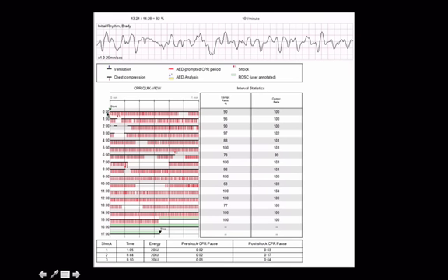In this lower section, each line is 1 minute during the time of the resuscitation. Each little red hash mark that you see is a compression. Therefore, sections like this are sections of compressions, and a section without little red hash marks is a pause. At the end of each minute, you'll see a compression ratio. So this is the percentage of time during that minute that you are doing compressions, and for that minute, what your average rate was. You'll see that minute by minute, that varies depending on the length of pauses in here.